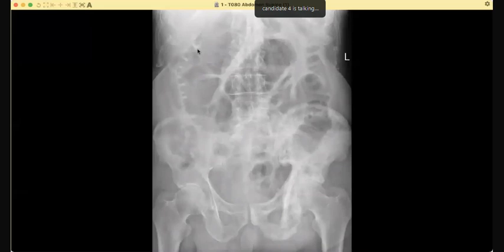Okay. I'm presented with the frontal abdominal radiograph of a 90-year-old male who presented with abdominal pain. At first glance, I can see that there are multiple dilated bowel loops. I'm trying to look for any free air. I don't see any obvious air under the diaphragm. I can see both walls of the bowel loops in the left paralumbar region.